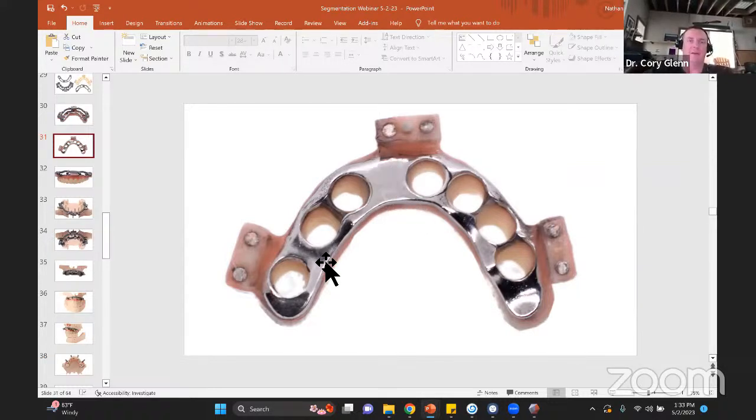I know this may not be intuitive, but to do this, you just design the shape, you have it printed, and you just bond it in with some cement. Like there's really not much lab work to it. If you're going to do it with Trilor, you're going to have to do a bunch of manual shaping of that Trilor. You're going to have to manually punch your holes. You're going to have to prime it, bond it into place, and then you're going to have to encase it. I just don't have to do any of that with this method.